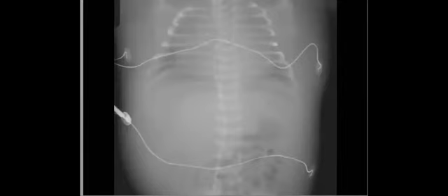I see that Marwa already mentioned that maybe something in the liver. I am waiting for all the description. I see that all the description is going to the abdomen, right? Perfect. So don't forget the upper part. So there is a cardiomegaly here, right? So you are going with two findings at least: cardiomegaly, and there is abdominal pathology.